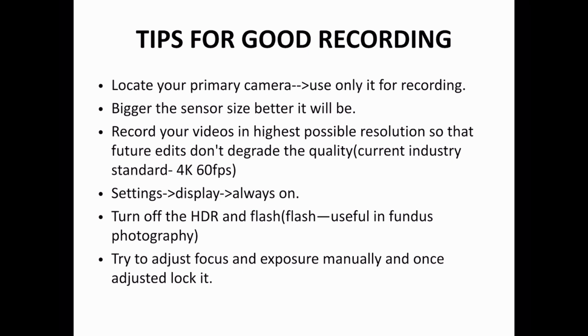Now, to keep the screen on during the whole recording, you need to go to the settings. In the settings, go to the display option. In display option, turn on the always on option. Turn off the HDR mode and flash. Flash can be useful in fundus photography. Try to adjust focus and exposure manually, and once adjusted, lock it.